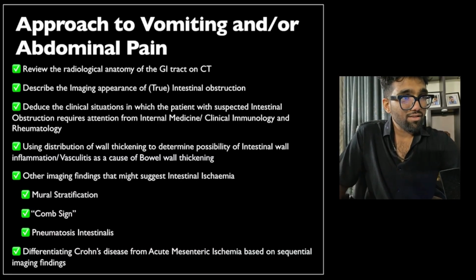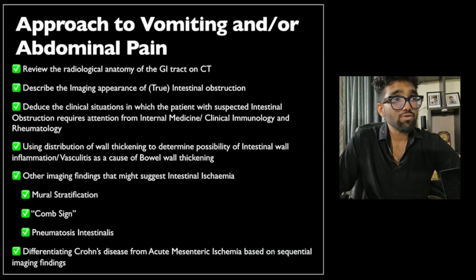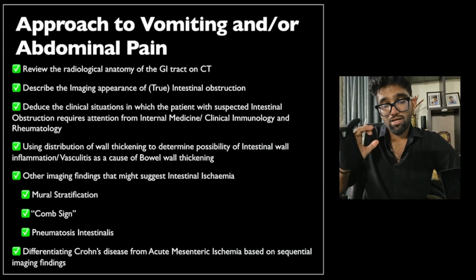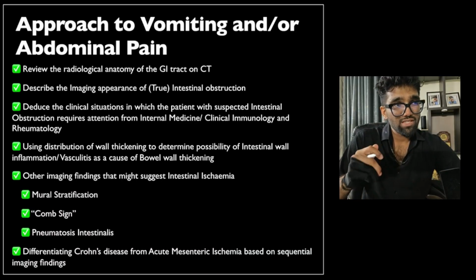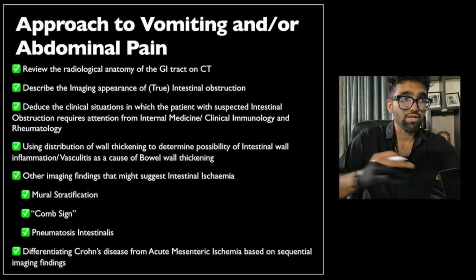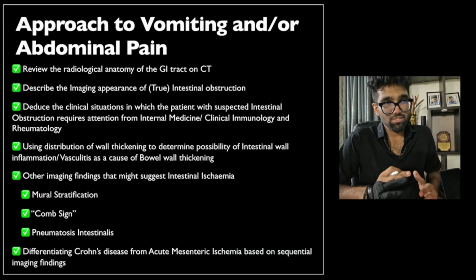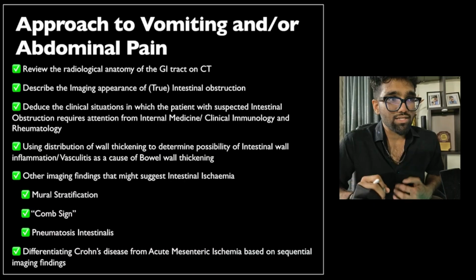So, as you can see, the final call on whether it is acute mesenteric ischemia or an inflammatory GI pathology often is made based on a combination of clinical presentation, so situation one, and the imaging findings, and often one says that Crohn's is more likely than ischemia, or ischemia is more likely than Crohn's or an inflammatory pathology, and we cannot really be 100% sure. It is in fact uncommon that you are 100% sure that it is ischemia or the other.